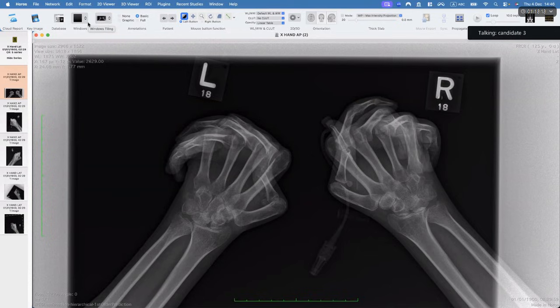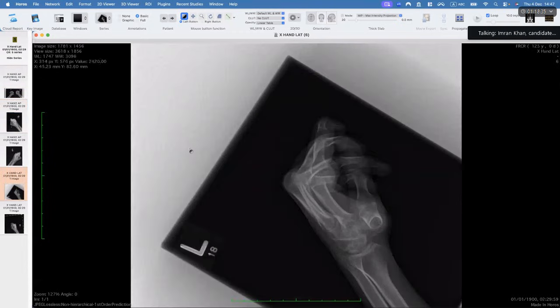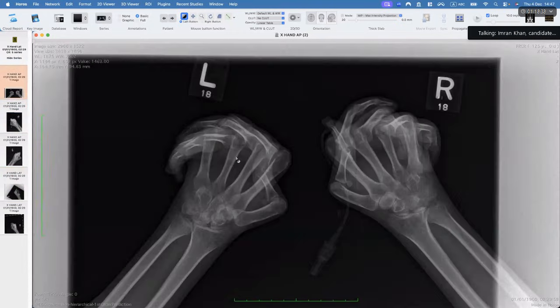The next step will be to review the other joints and previous radiographs for other appendicular joints. I will also ask for rheumatoid factor and CRP investigations and a rheumatology MDT. Okay. Stay with me on this case.